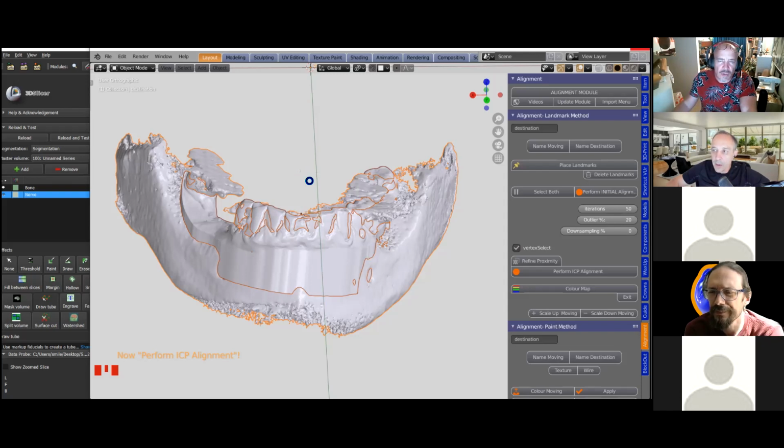So can you just repeat that question? The refine proximity, I see it in the tutorial that we use it when we perform the scan bodies alignment for an implant model. With this type of function, we can have a really very precise alignment between two geometrical objects, when we have the component from the library and the component that has been scanned into the mouth with the IOS.